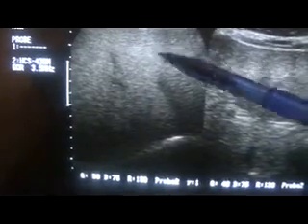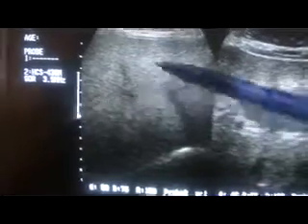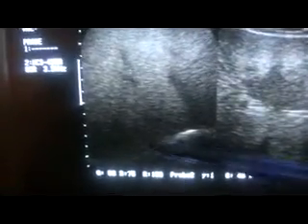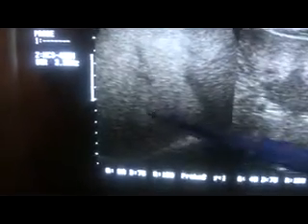So whenever there is so much fat within the liver, you are going to see the right kidney parenchyma black compared to normal. So these minor things have to be remembered at times, because if you don't know this difference, one may easily label this area as a focal lesion in the liver, or a mass.